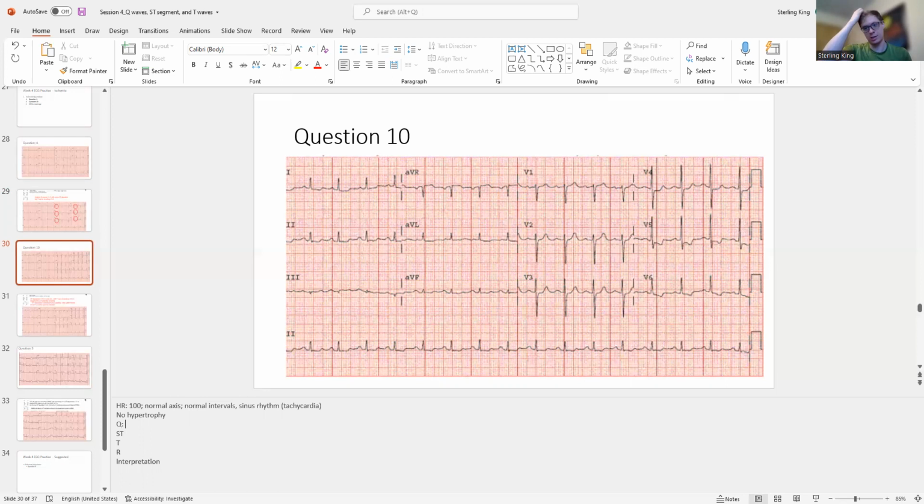Just because I'm doing this on a computer, I might shift my approach to doing all the Q waves and so on together. This makes it a little bit easier for me, but I prefer the table if I had the check boxes, way faster. Q waves, nope, nope. No, non-lateral, so no lateral. I guess I'm already doing it. ST. Maybe, nope, not lower.